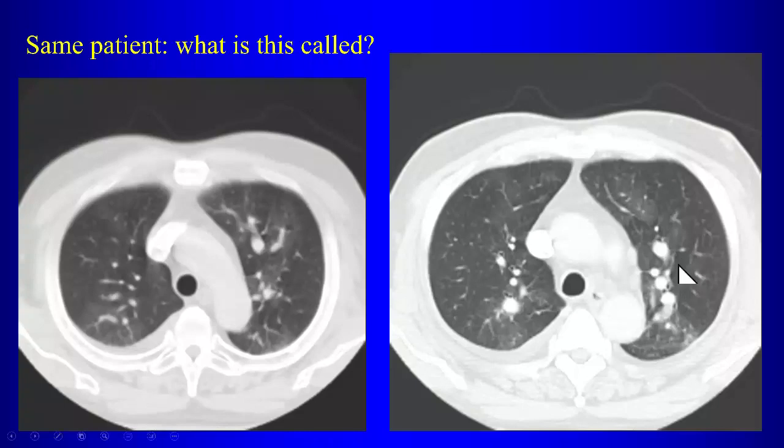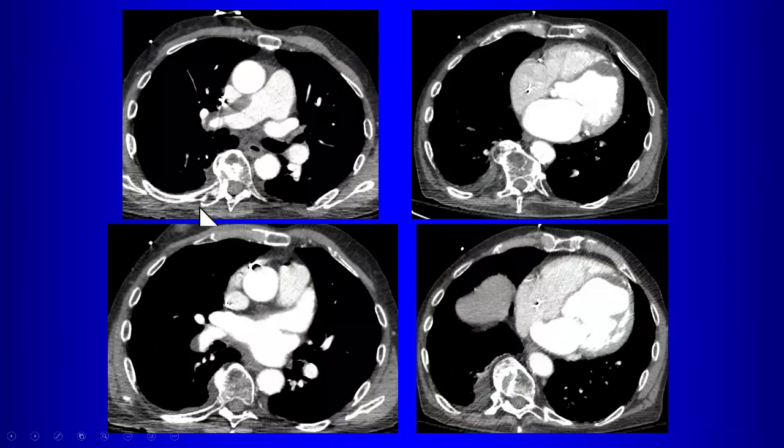Now how can you differentiate air trapping from chronic PE, if they can both give you mosaic perfusion? Well, first you look for the chronic PE, right? Big central vessels, chronic PE. And secondly, the distribution is somewhat different. With chronic PE, you have these larger areas of mosaic perfusion, whereas with air trapping, it tends to break down into secondary pulmonary lobules. We'll see cases of that as we progress this year, okay? So that's an example of mosaic perfusion.